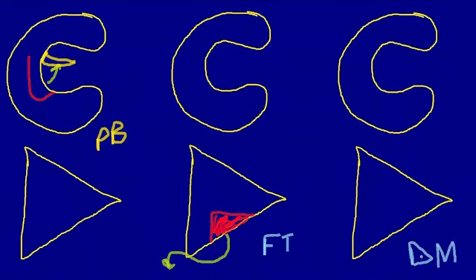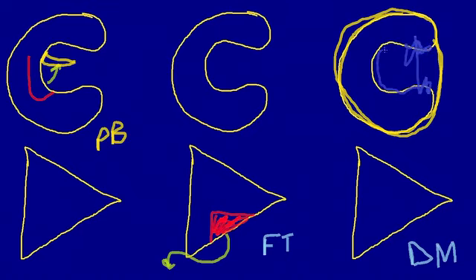And basically what a discoid meniscus is, rather than having the appearance of a C, the discoid meniscus is looking like a disc. So you can imagine that rather than looking like a C, it'll look almost like a CD or a Frisbee, where the meniscus is basically looking like an O. I can't actually delete all of this, so pretend I was able to delete all of these marks. But the meniscus is abnormally enlarged and shaped like a circle rather than a C. And also the appearance on the coronal plane will take on more of a rectangular shape.